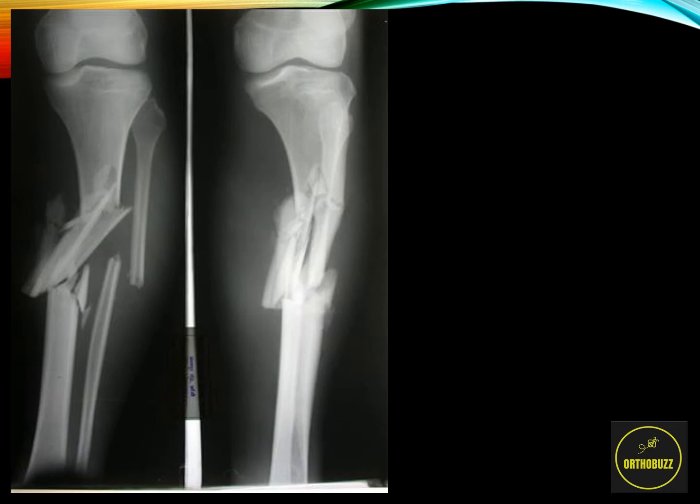And finally, let's have a look at this last example. So, first step is, which bone is this, and which part of the bone is fractured? We can see this is the femur over here, and this is the tibia here with the fibula next to it. So therefore, this is a tibia and fibula fracture, and this is again in the long tubular aspect of the tibia and fibula as well, and therefore this is a diaphysis or diaphyseal tibia and fibula fracture.